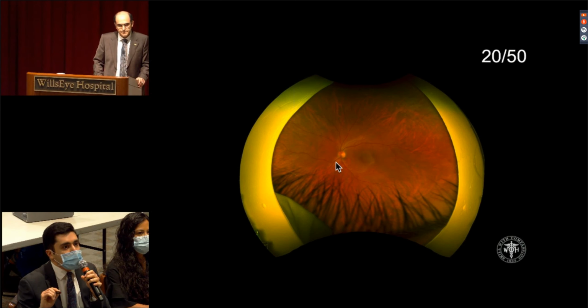And more prominently, we can see this distinct appearing geographic lesion in the central macula, well-defined edges here, maybe even emanating around the disc as well. And in terms of the retinal periphery, mid-periphery appears pretty intact. I don't see anywhere else of any pure vascular or perivascular involvement or hemorrhage.